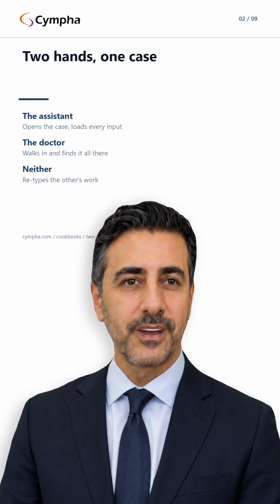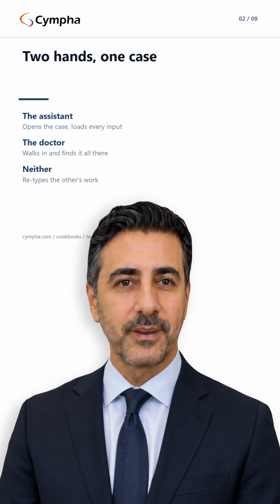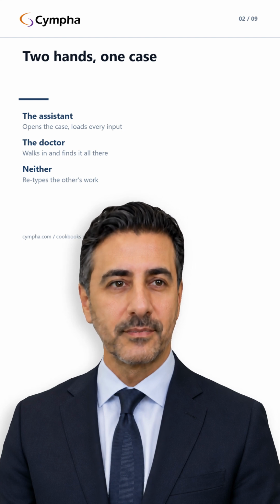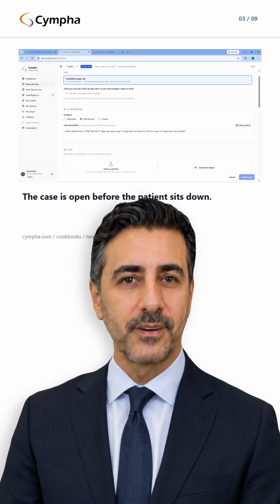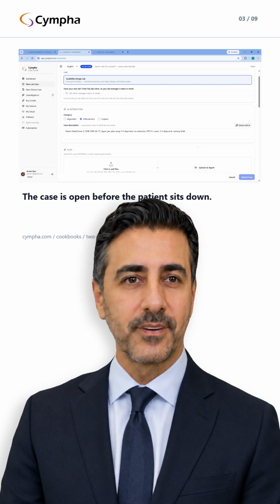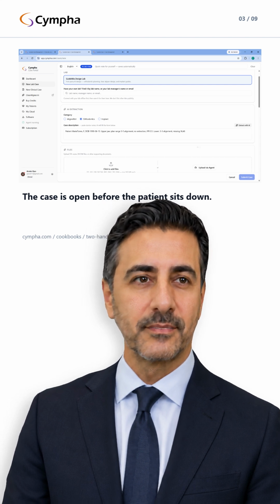cympha is built around the division you already have. Your assistant owns the inputs, the demographics, the photos, the scans. The doctor owns the thinking, the exam, the diagnosis, the plan. Each person works on the part they actually own, and nobody retypes the other's work. The patient is never asked the same question twice.